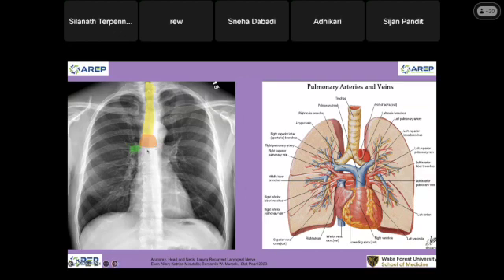And then after that, it will divide into the right main bronchus and then the left main bronchus. On the right, you see this little air column, the lucency here. If you go down a little bit further, this is the left main bronchus. And if you follow the left brachiocephalic, I don't have an illustration to show, but this is the clavicle.